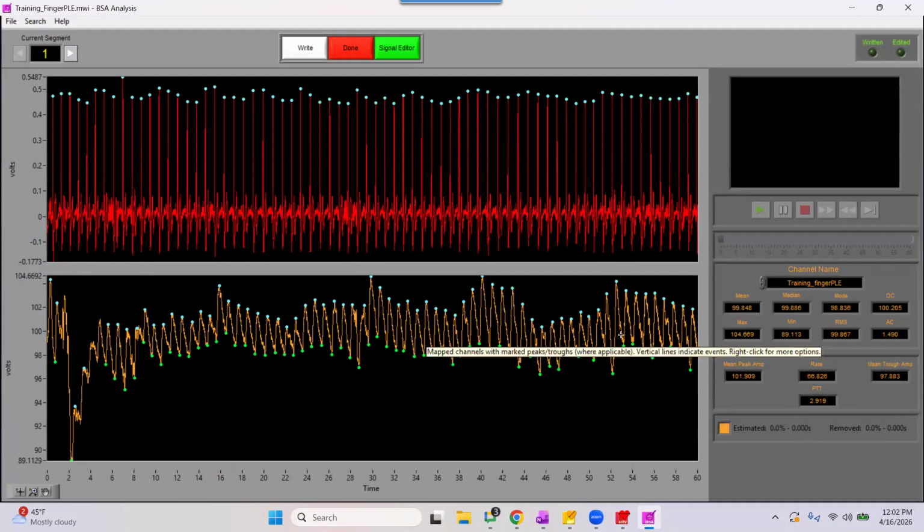So unlike the HRV analysis app, where we are really concerned about continuity, with PPG and pulse transit time and overlaying these signals, we are throwing continuity out the window. We no longer care if we have 30 seconds of continuous data. Instead, again, this is the overlay of these two waveforms, so we care about good R peaks and good systolic peaks on a cycle by cycle basis.